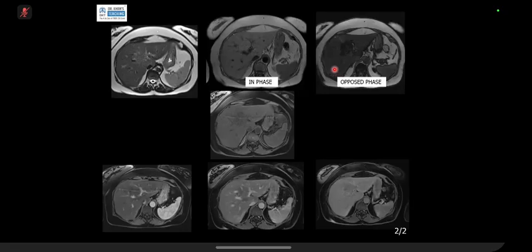Over that, what is happening? In this region, it is even blacker, right? So the magnitude of focal fatty infiltration is even more. This is in the territory of pseudomass.